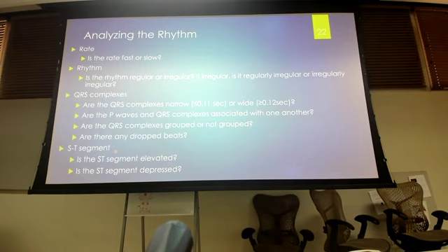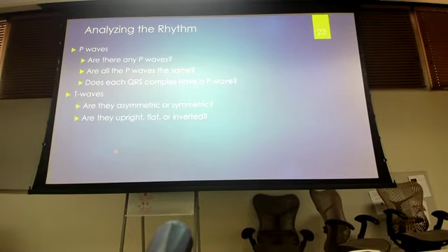The next thing we're going to do is look at those ST segments. We're looking for those ST segments. Are they elevated? Are they depressed? Because that ST segment should be in a line with our PR segment, which is considered our baseline for the ECG.